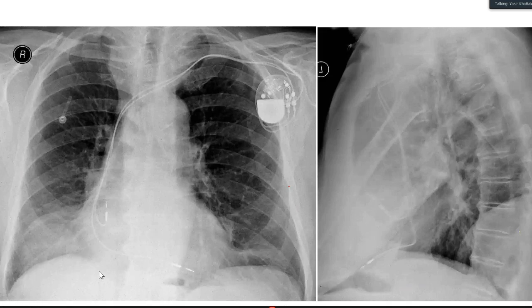Again, now this can be a case of diaphragmatic injury or paralysis. But in this one, the question is: is the right diaphragm abnormal or is the left abnormal?